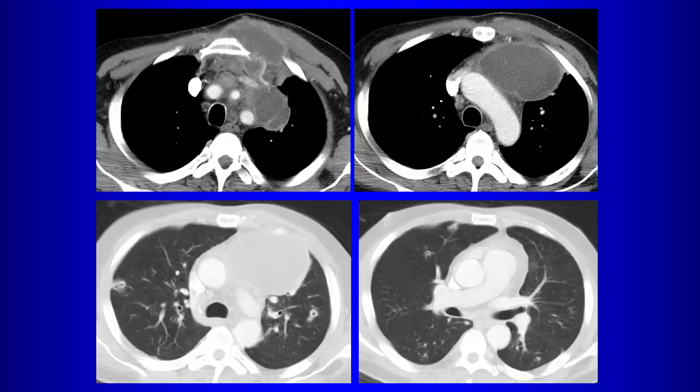There is another unusual infection that can affect immunocompetent patients that can extend to the chest wall. What infection is that? It's an unusual infection. Well, nocardia, which is what this was, nocardia in an immunosuppressed patient. This was an HIV patient with nocardia. But in an immunocompetent patient, what infection? Actinomycosis. Yeah, actinomycosis. So TB, actinomycosis, and in a patient who's immunosuppressed, like this patient with HIV, nocardiosis. This was a case of nocardiosis.